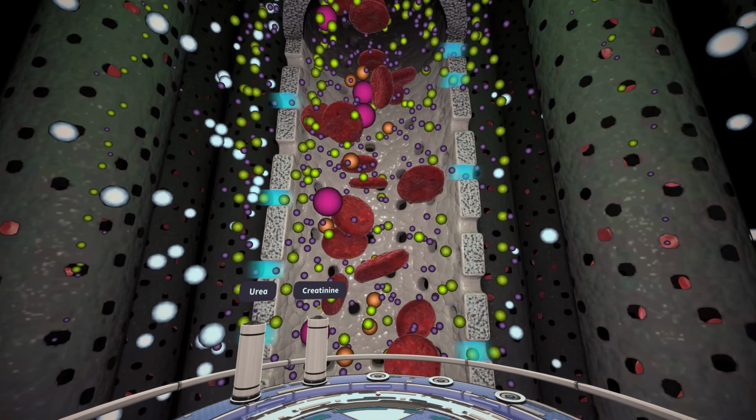In dialysis, we create a concentration gradient on purpose, so we can make use of diffusion. Dialysate does not include urea or other wastes. Waste solutes that are small enough, such as urea and creatinine, pass through the membrane pores and will move out of the blood and into the dialysate. All molecules, and especially larger molecules, are helped through the membrane by the flow of fluid that flows through the membrane from the blood compartment to the dialysate compartment. The larger molecules can only go through larger pores. This is convection and adds to waste removal for solutes like beta-2 microglobulin.